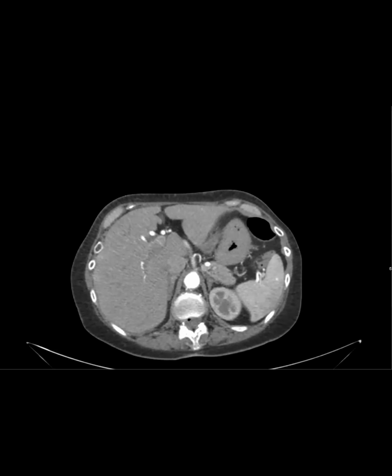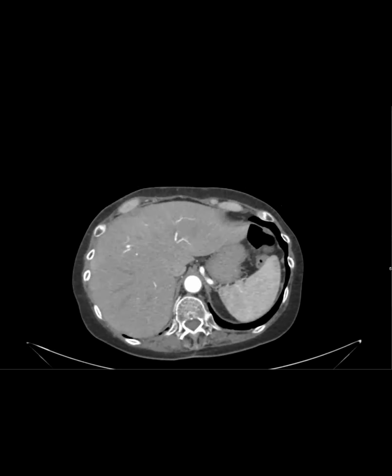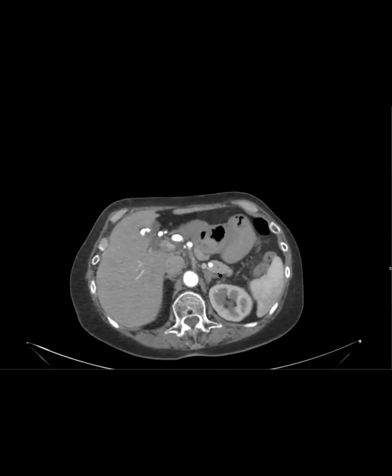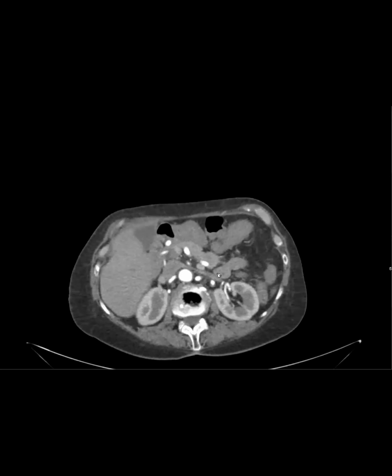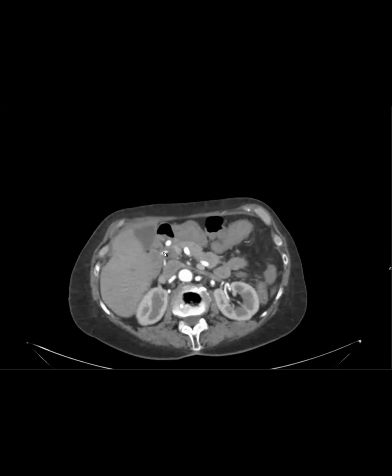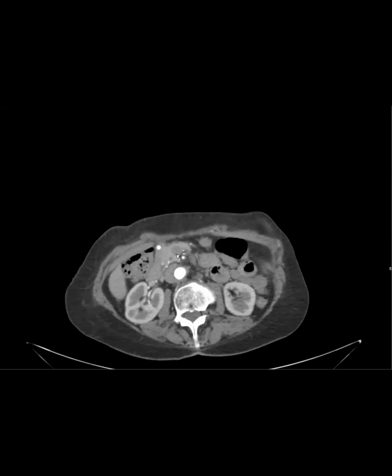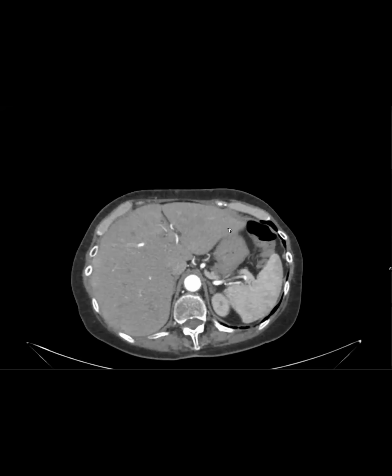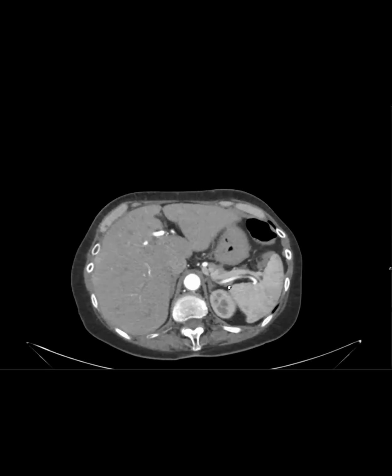Sorry, Aarti, I thought maybe the stomach was a little bit thick, like it is seen with gastrinoma. I mean, it's collapsed. Did this have anything of a gastrinoma, or just insulinoma? Their gastrin level was normal, and normally gastrinomas are more common in the gastrinoma triangle, so pancreatic head, duodenal wall, groove area. So I think this was just a collapsed stomach, but that's a good point.